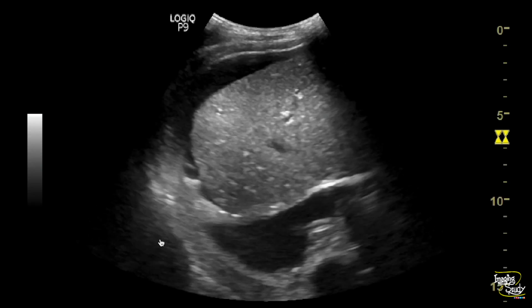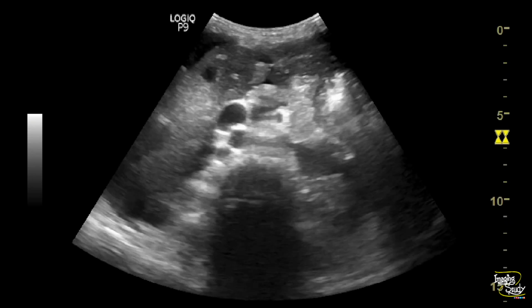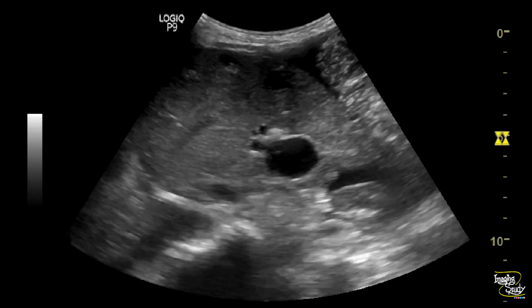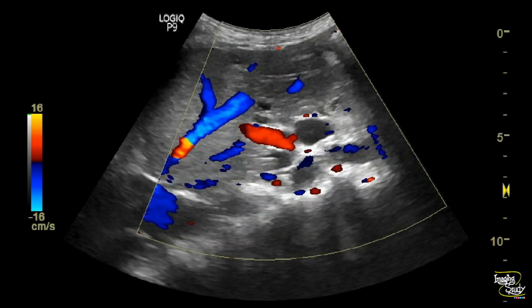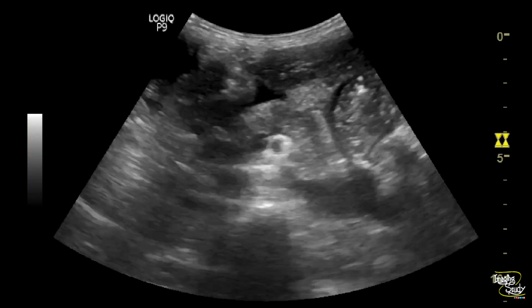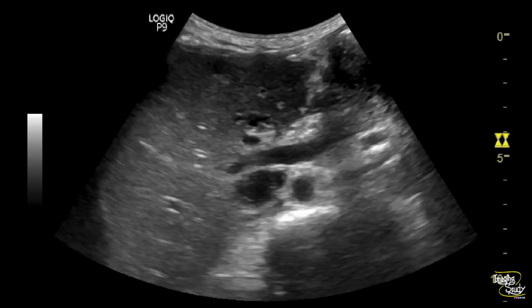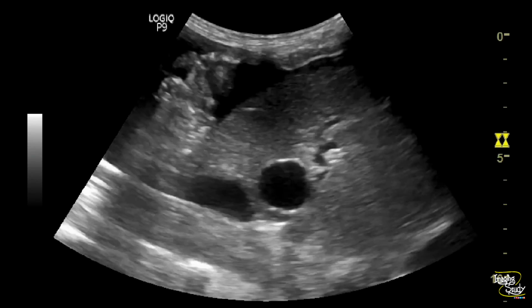If you see a patient with a distorted liver with multiple hepatic cysts and presence of ascites with or without pleural effusion, if the patient is a female, then you definitely should scan thoroughly the adnexal region. You also should evaluate the pancreatic region. So these lesions may not only be the simple hepatic cysts, rather they may be the cystic metastases. We'll discuss about the cystic metastasis later.